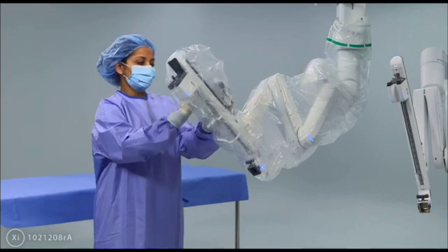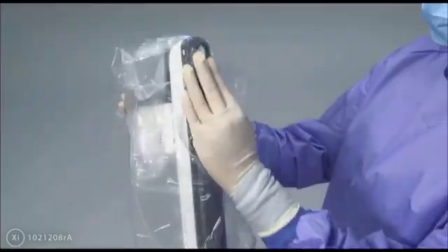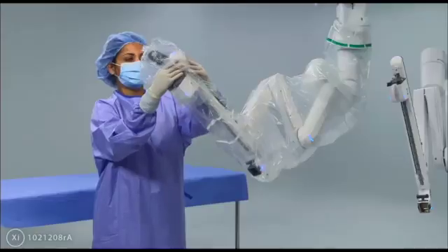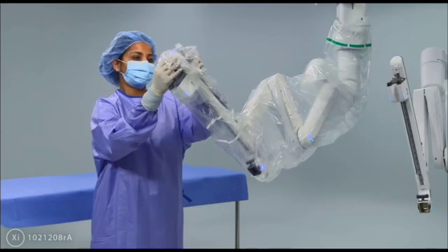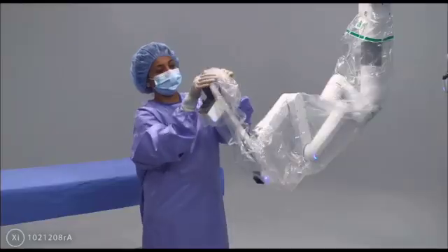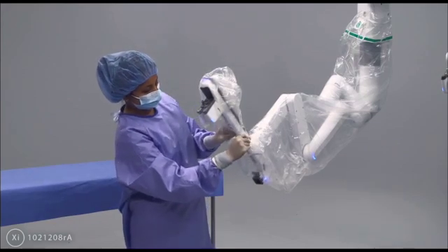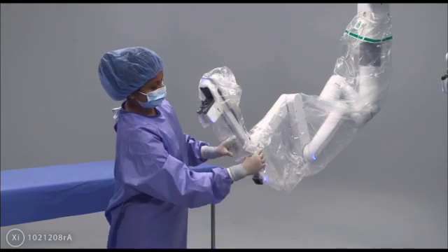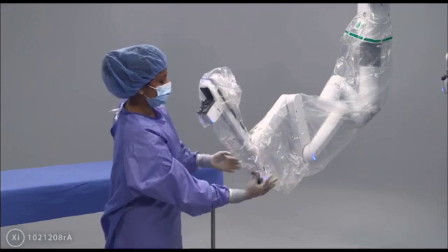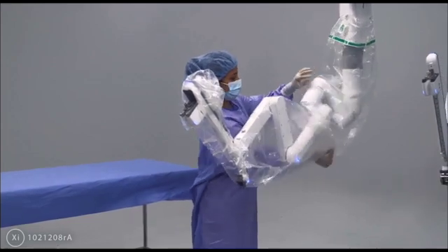Then, the sterile staff member releases the tearaway tab on the back of the drape and carefully slides the drape material away from the gray handle. He or she stabilizes the gray handle and snaps the arm clip into place. Then the sterile staff member bends the flex strips to create a U shape for a clear instrument insertion path. The sterile staff member then completes this process for the remaining arms.